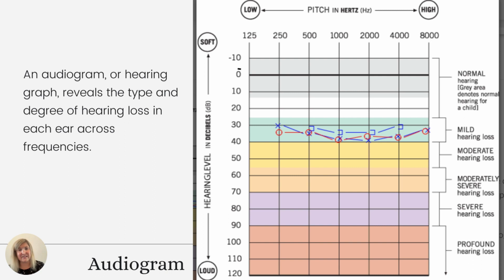Along the x-axis, we measure frequency in hertz, from 125 hertz all the way up to 8,000 hertz. On the left side of the graph are low, deep bass tones, and on the right side of the graph, closer to 8,000 hertz, are higher pitched treble tones.